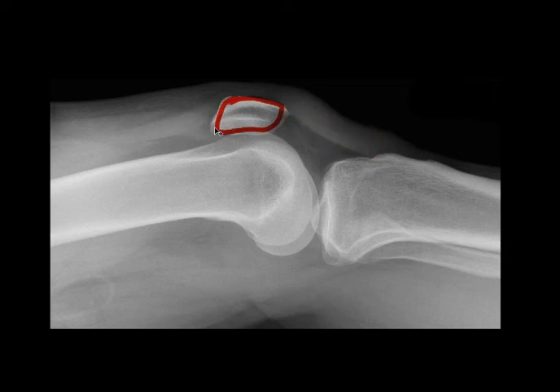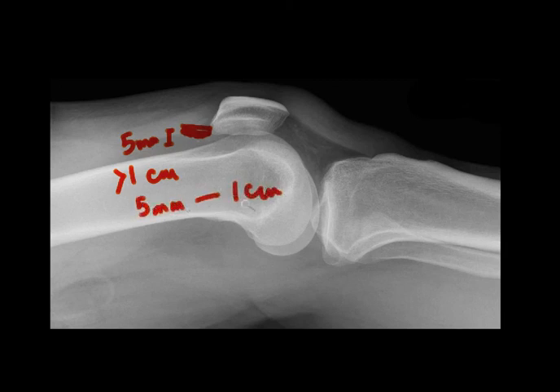While evaluating the patella, just superiorly we note that there is a soft tissue band which merges with the soft tissue of the muscles in this region, and this area is the suprapatellar bursa of the knee joint. In cases where the patient develops knee effusion, this would appear abnormally thick. The usual measurement is quoted as 5 millimeters or less. When it is more than 1 centimeter, there is a definite effusion. If it is between 5 millimeters and 1 centimeter, there is a possible effusion. So one should look at this area to look for the signs of knee effusion.